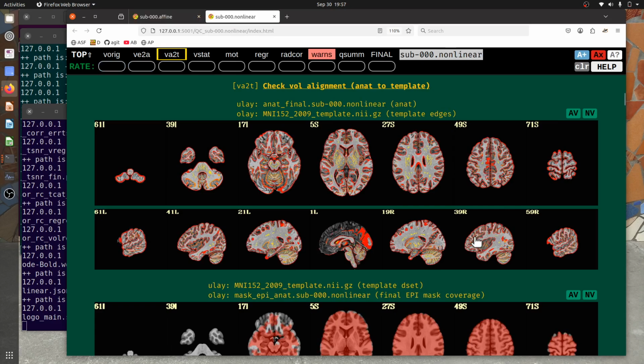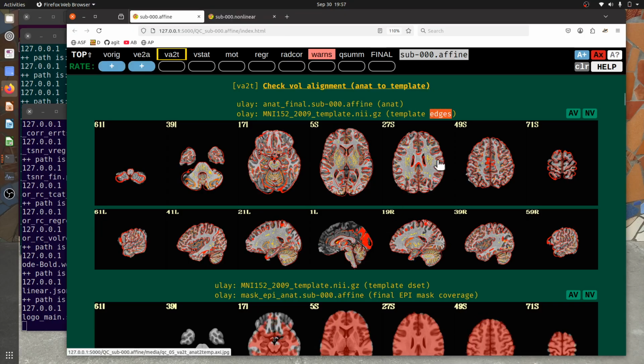So, all right, that is looking at our alignment here, and that's again a necessary and useful thing to look at visually. The cost function does what it can do quantitatively, but to really judge did the cost function do a good job, it really takes a visual inspection.